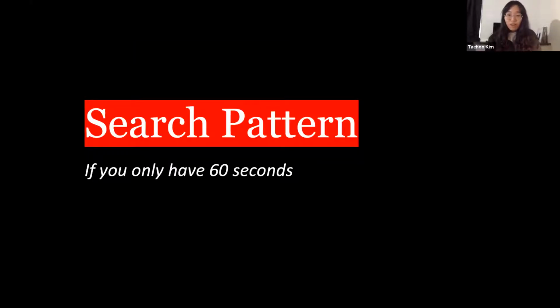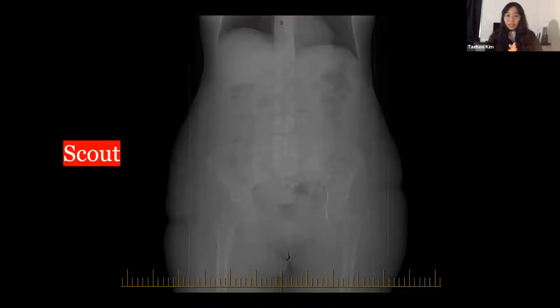Before we talk about what's abnormal, I wanted to show you what's normal and also my own search pattern when you only have 60 seconds. Reading a CT scan can be very easy. I like to start with a scout image. A scout is basically what CT techs use to know where to scan in the body. It's like a blueprint for the CT techs. The reason I like to use it is because it's just like X-rays. So you have the scout of the CT abdomen here, and basically you have the same view as when you read an X-ray. So our eyes are really used to it.